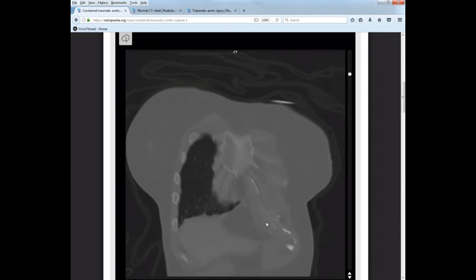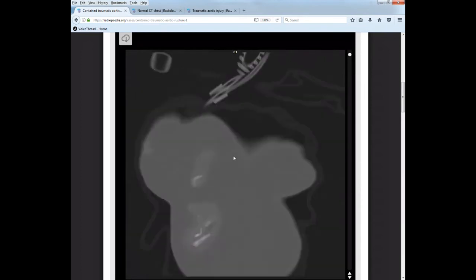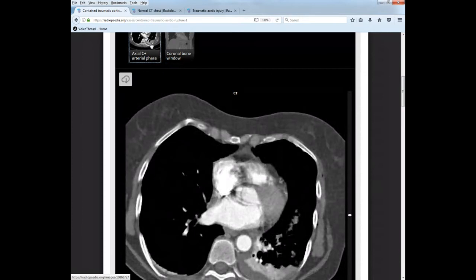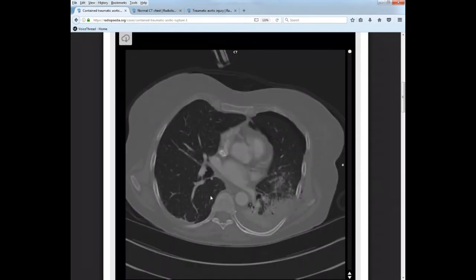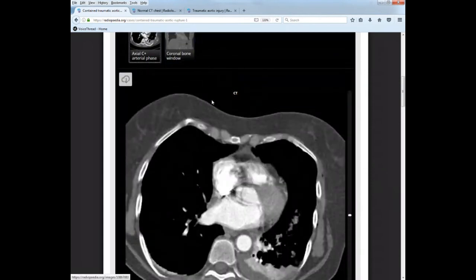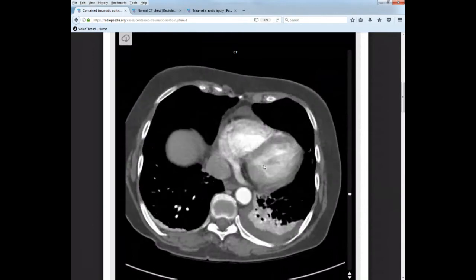Piggyback right there, okay? So there's your cartilage attachments. Let's switch. Oh, this gave us one slice of an axial in the bone. Let's switch back over to our axial. And even in a traumatic injury patient, I want you to point out the cardiac notch, the lingula.